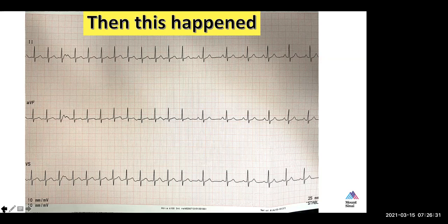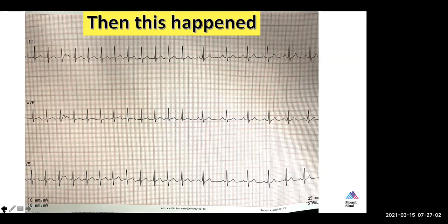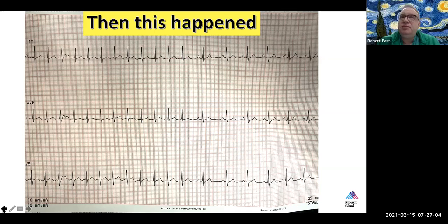So the thing is, if we can see retrograde P waves, which I'm trying to find, then that's more likely an ORT from an accessory pathway, versus if we don't, then it's AVNRT. That's correct. What RP interval would be most consistent with an accessory pathway? 80, 70, and above. Greater than 70 milliseconds. 70, yeah. So that's exactly right.